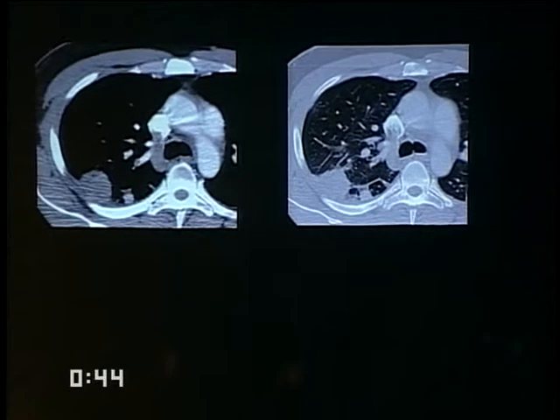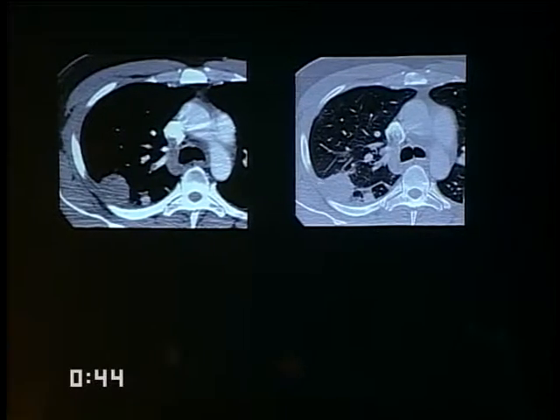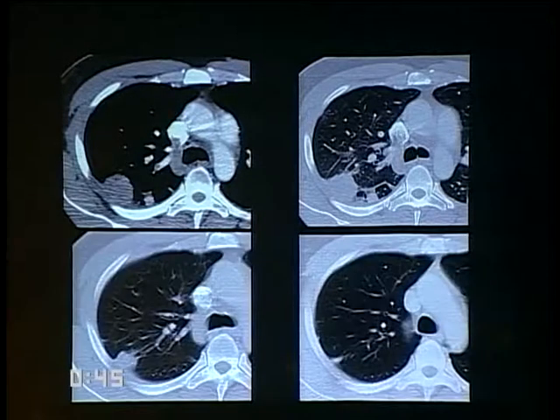This is another patient that did have documented pulmonary embolism. You can see a part of it here in this upper lobe branch, and had a very nice example of a Hampton's hump, though not one that would so easily show on a chest X-ray, but it has that broad pleural base. It has a convex margin pointing towards the hilum, and here you see it on the lung setting, and again this was an area of focal hemorrhage and infarction. The reason I'm showing you this is we had an opportunity to follow this patient over time.